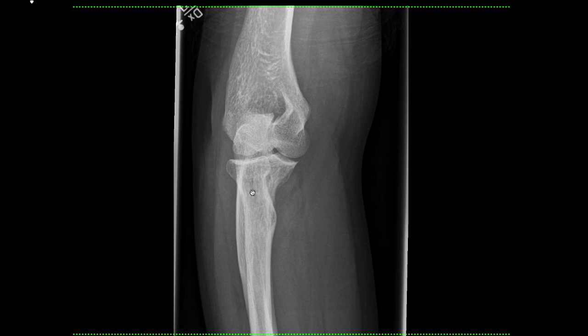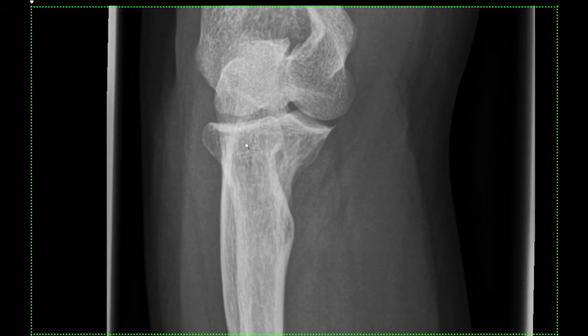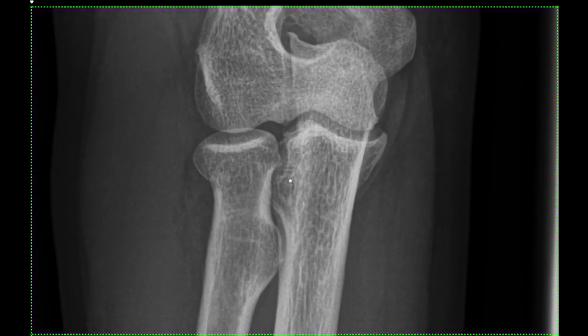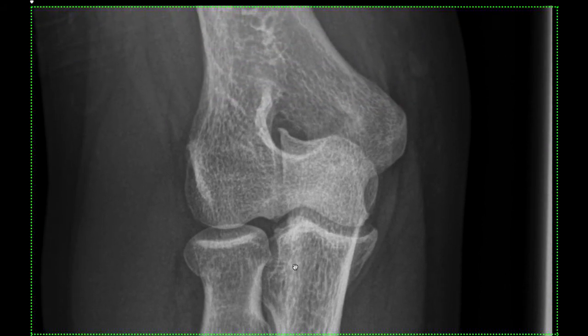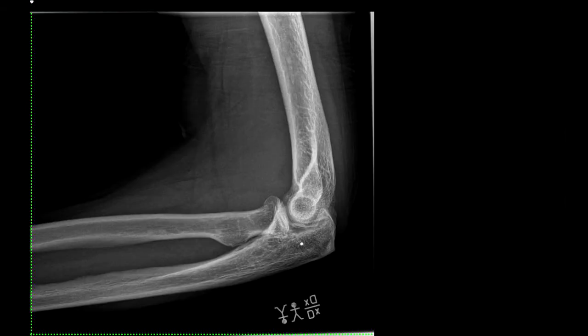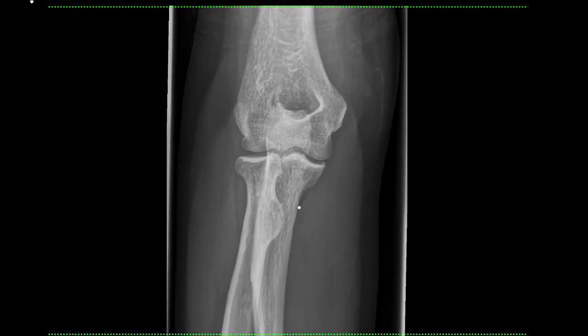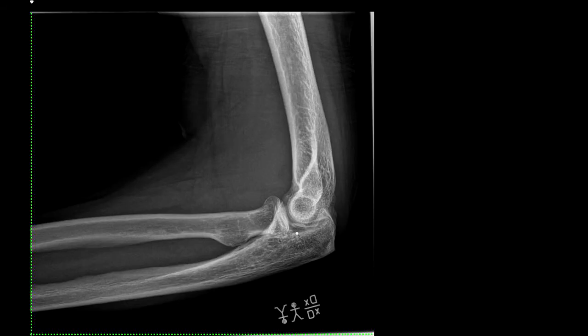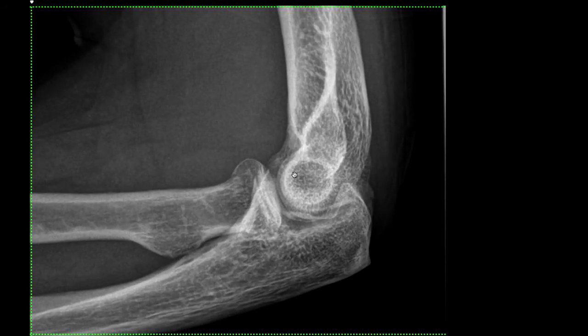I can't really say I see anything major. Even if I stare here, I don't see anything. I don't see anything here. I'm sorry to disappoint you. And the last angle, I don't see anything here either. Wait, let's go back to the original one.